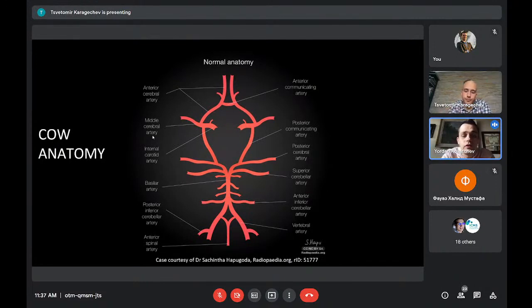And on the front, we see the carotid arteries that go through the neck up to the carotid siphon. They have 7 segments. Anyway, when the carotid arteries enter the brain on both parts, they become the middle cerebral artery, and they supply, I would say, really the majority of the brain. So this is the one artery that I want you to remember right now, even if you forget the others. The middle cerebral artery, it's a continuation. On both sides there is one.